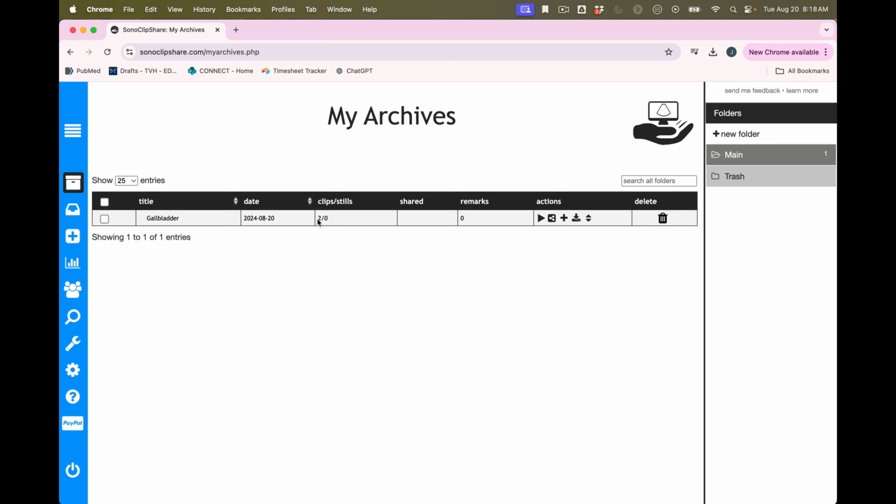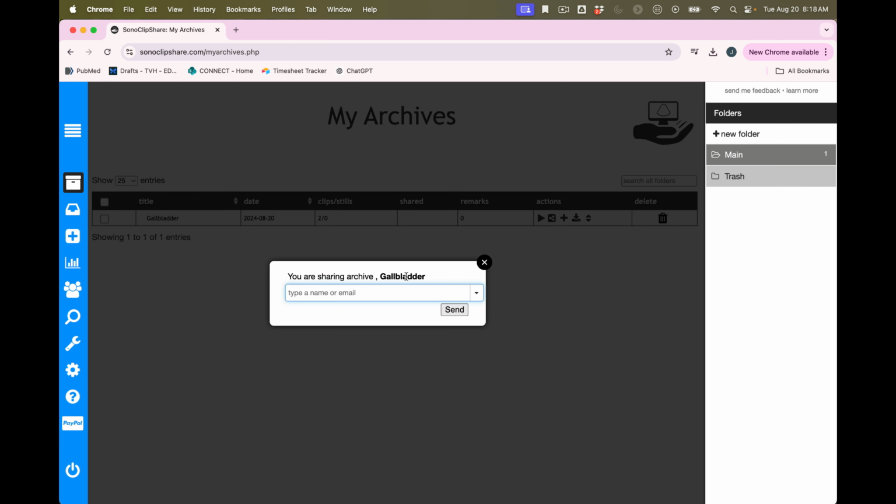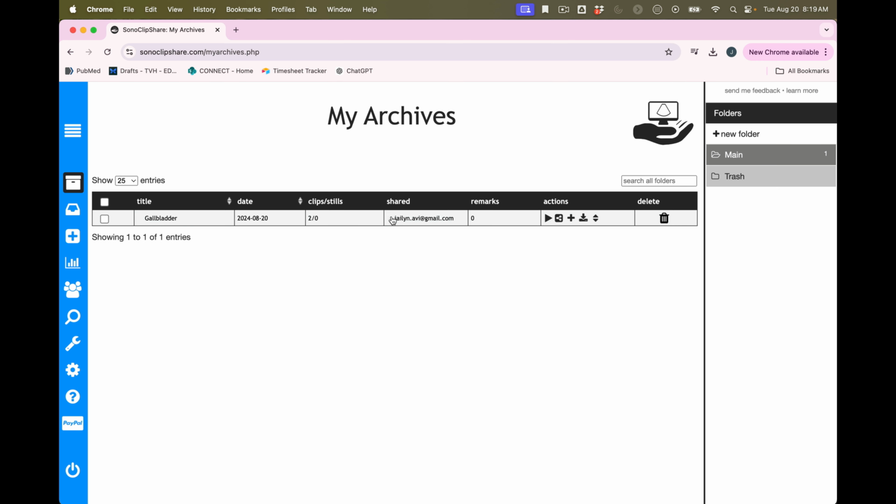Now, this is key if you are part of the Ultrasound Leadership Academy, or if you want to share this with anyone, either to show them the scans for their curiosity, or if they're reviewing them, you're going to click share this archive. And we're going to type in an email. I'll type in my email. And then we'll go ahead and send it. And now it's been shared with me. So now I will have access to these.